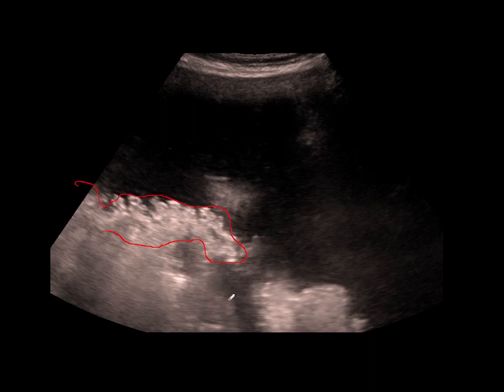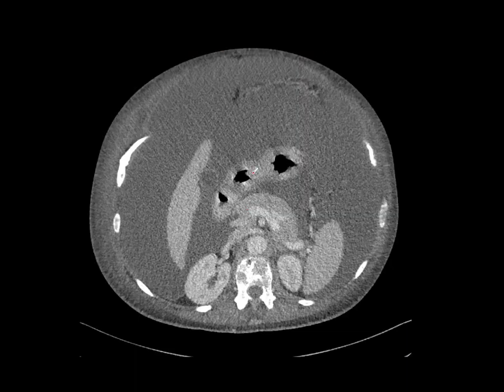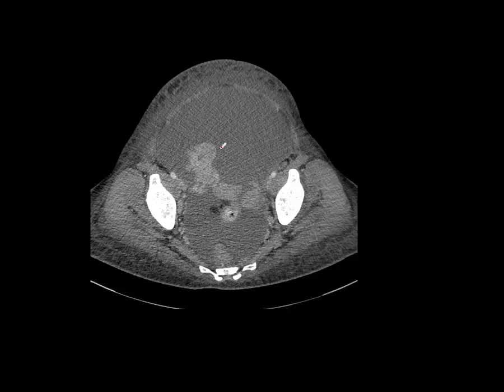And of course behind that, as we'll see in a minute, you're going to have some bowel. So we've got ascites here, we've got omental tumour here, we've got bowel here. We're going to have to get some tissue on this patient, and often we try and get a percutaneous biopsy of the omentum. So what's important here is, here's our patient with ascites, omental tumour here, and here's our ovarian mass.